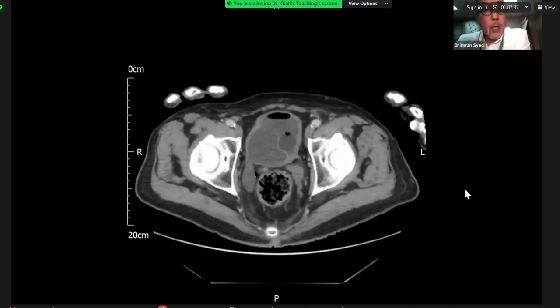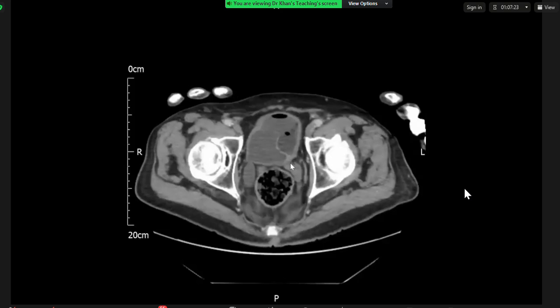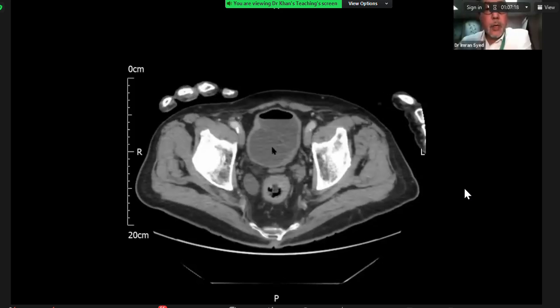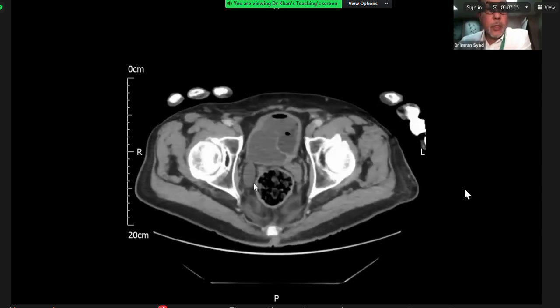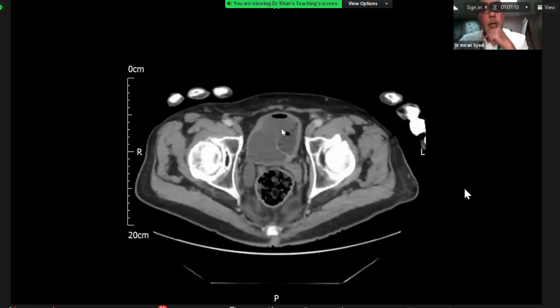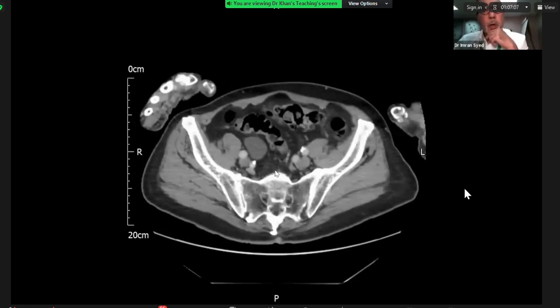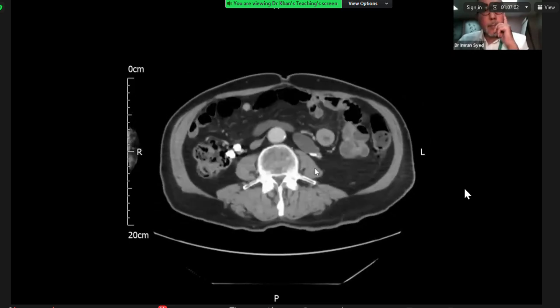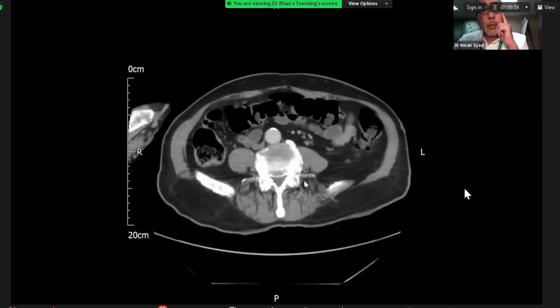to the right kidney, and equally can cause, for the record, an obstruction to an upper pole or lower pole moiety. Adjacent to this, you've got this structure, which is a urinary catheter, and you've got some air within the ventral bladder lumen, and that's obviously due to bladder instrumentation. So a nice case of a large ureterocele and the consequences of that in terms of causing cross-fused renal ectopic obstruction, as we've just seen here.